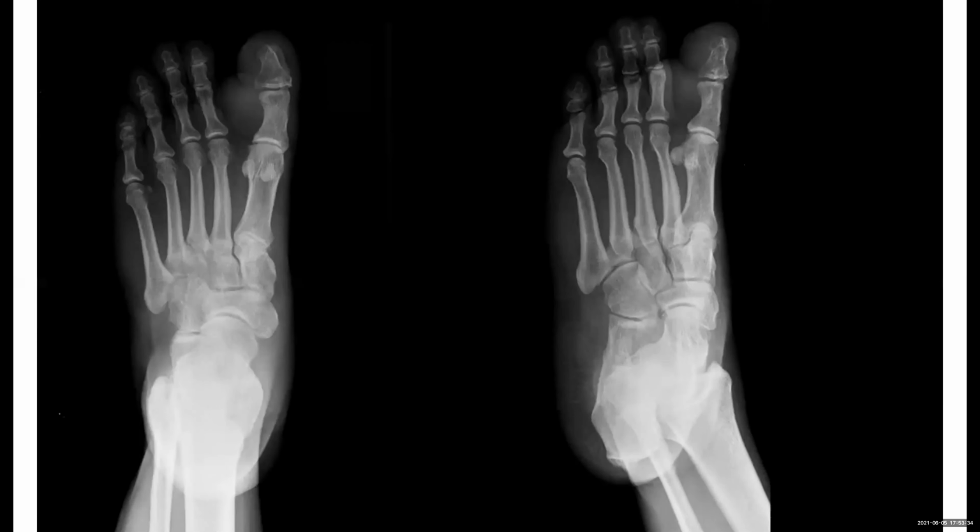I can see that there is significant soft tissue swelling at the base of the great toe, however, there is some compression or deformity of the underlying proximal phalanx. The joint spaces are intact. The joints are normal. There is no air lucency within the soft tissue swelling, and there are no similar soft tissue swellings seen in the rest of the radiograph.